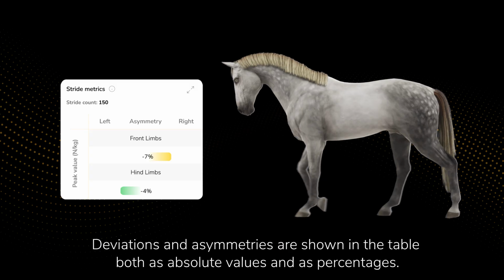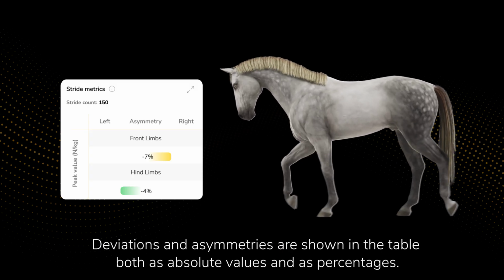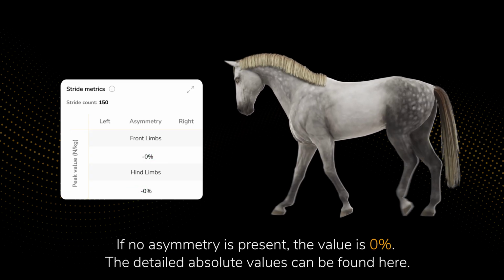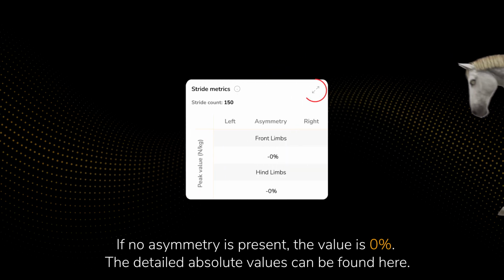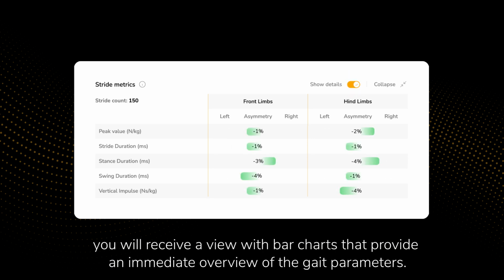Deviations and asymmetries are shown in the table both as absolute values and as percentages. If no asymmetry is present, the value is 0%. The detailed absolute values can be found here. If you tap Show Details in the extended table, you will receive a view with bar charts that provide an immediate overview of the gait parameters.